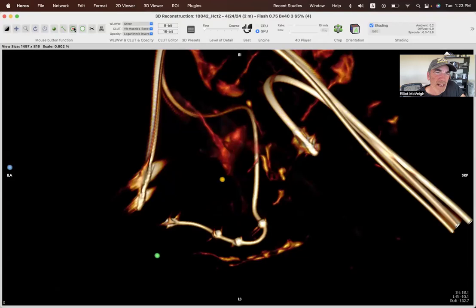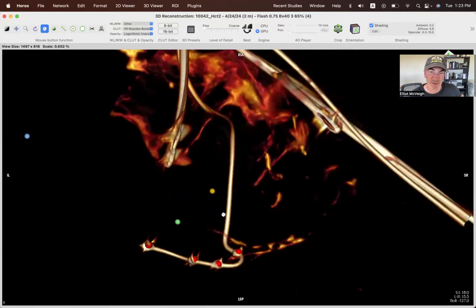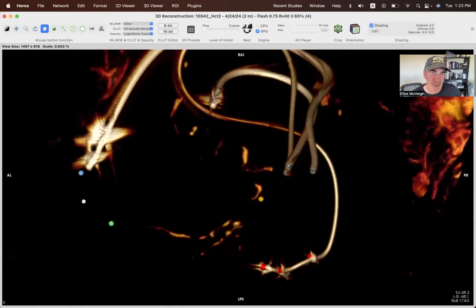And now go back to the point selector for the ROI, and I'm going to select the most distal, that's LL1, left lead 1, left lead 2, left lead 3, and left lead 4. Okay. And let's go back to the little cube, and we can rotate that around, and there our points are marked, and it's very efficient, really fast way to do it.